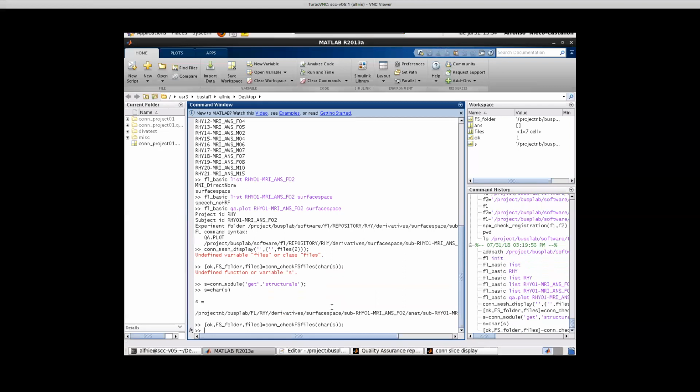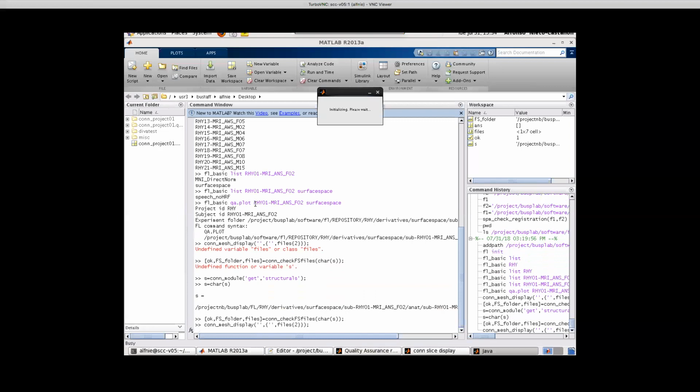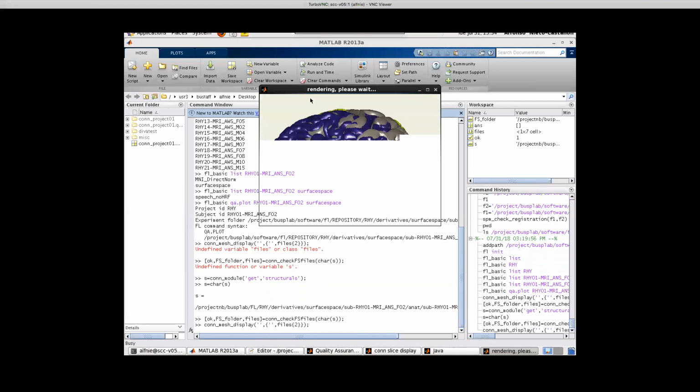Okay, so I can easily. I mean, that was the plan, to have both the white and the pial surfaces on the functional data. That is the one plot that I was already aware that I was missing. But the question is whether we want to have something like this. So let me ask you. I mean, showing something that is similar to what we. Or just do it manually for 1 second.